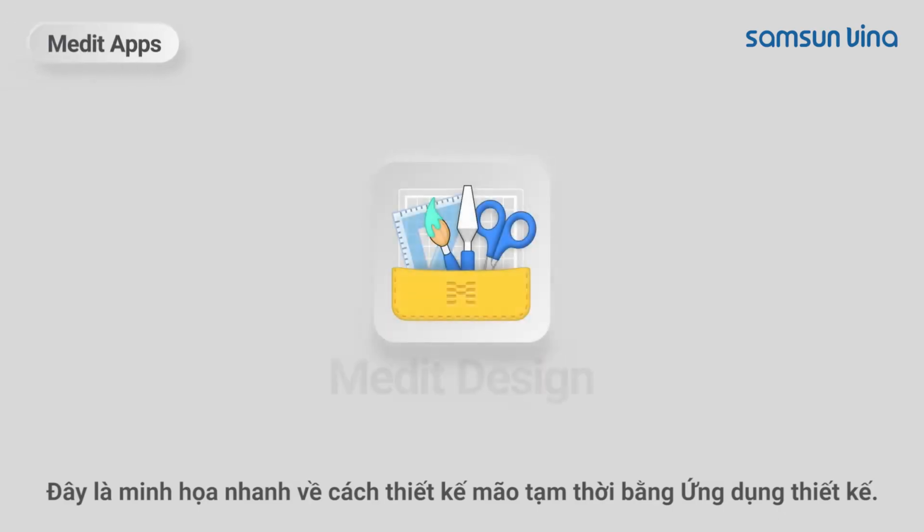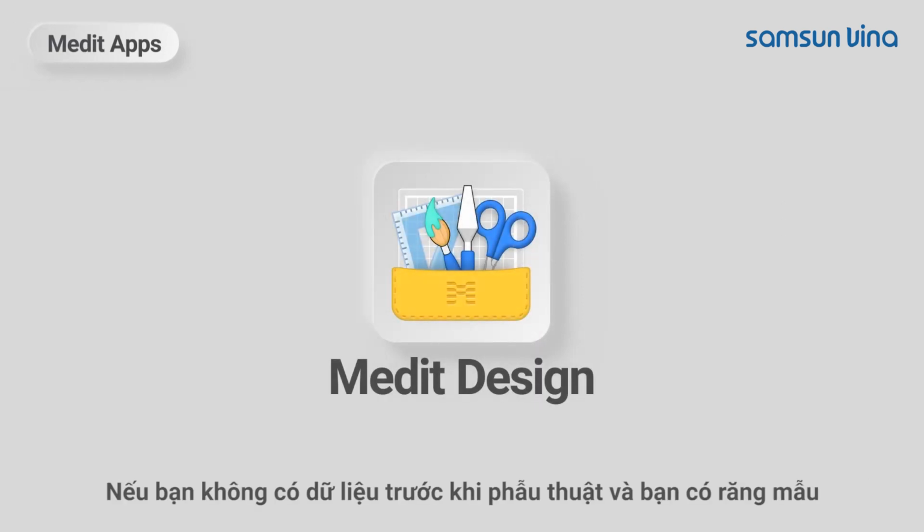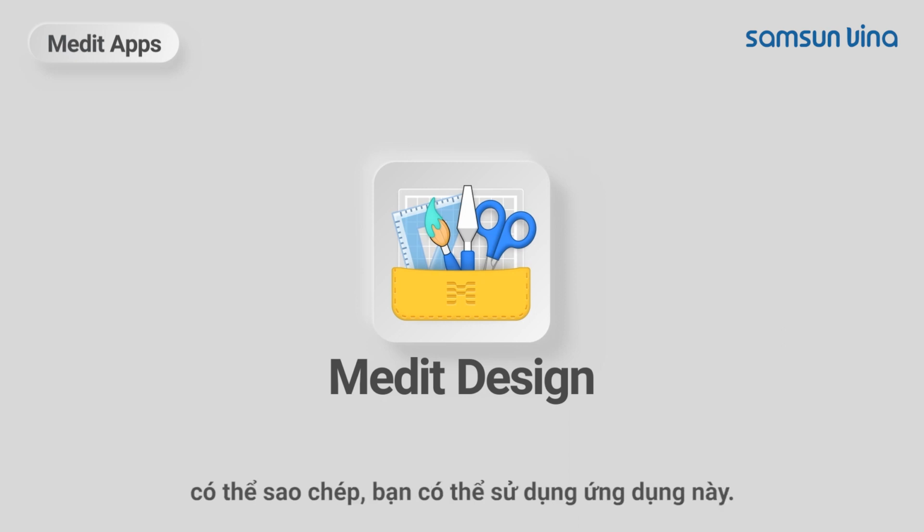This is a quick demonstration on how to design a mirrored temporary crown with the Design app. If you do not have preoperative data and you have teeth that can be copied on the other side, you can utilize this app.